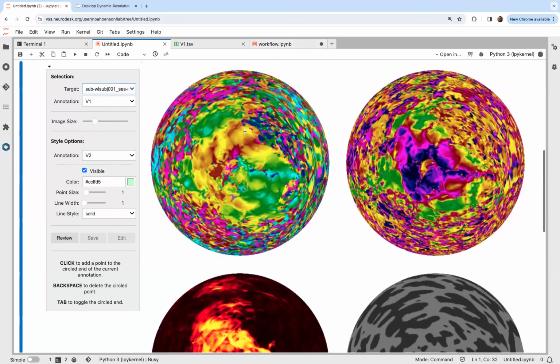Okay. I just wanted to show you this subject's left hemisphere real quick because there's something a little weird about it. You notice that we can kind of see V1 here and V2, but there's sort of this weird shape to the retinotopic map. And there's kind of a discontinuity in the V3 boundary. This is something that we see in a lot of retinotopy subjects, and Fernanda, I think, is going to talk a little bit about it. So I thought that would be a nice introduction.